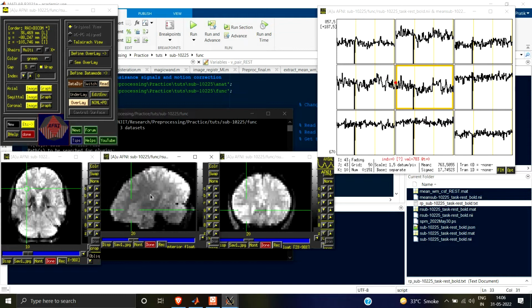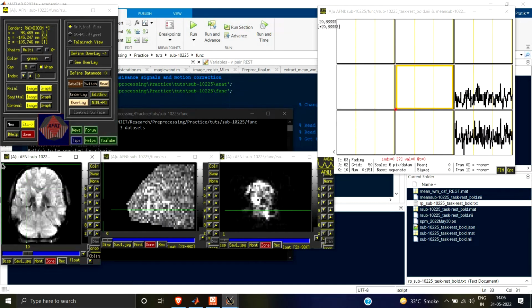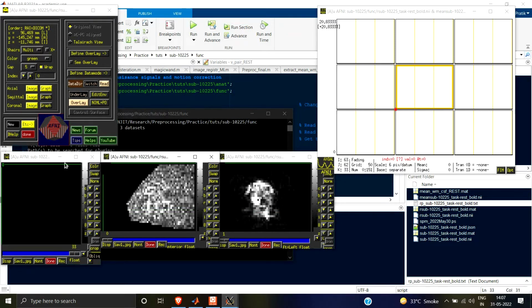During temporal regression, we are going to go from this corner, the first voxel, and scan the entire slice. Then we'll start over here at voxel 0,0,0 and take the time series.